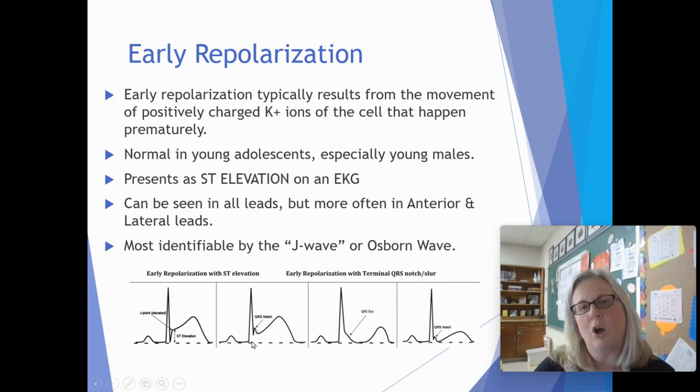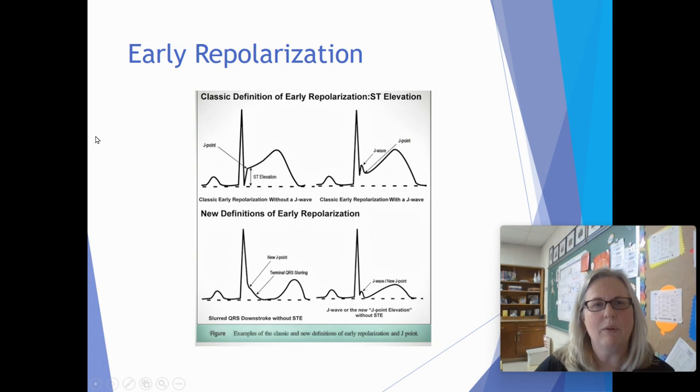Okay, it's also called an Osborn wave. So early repol, very common, athletes, younger males. Don't see it so much in females. It's more the male population. All right, let's keep going.